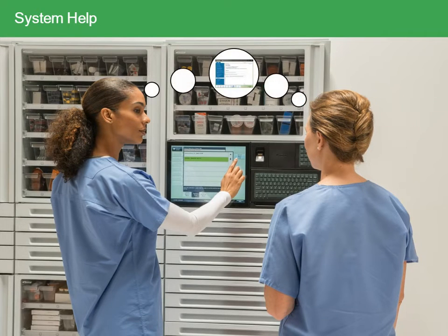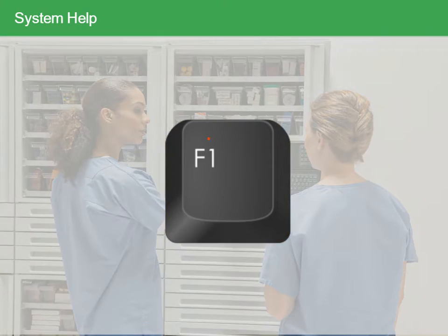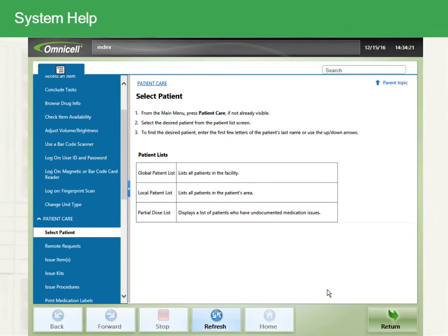After logon, you can access the guide by pressing F1 on the keyboard. Once the guide opens, you may scroll through the help sections. If you're looking for an answer to a particular topic, use Search to find it.